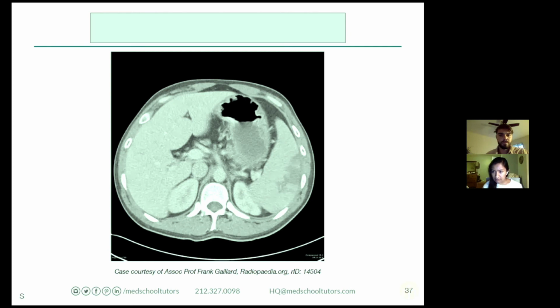Good. All right, so we have one person who's gotten it so far. Anybody else? Okay, good. Up to 2, 3. Okay, people are getting it now. All right. Very good. So the big thing here that I'm looking at is this irregular hypodense lesion in the spleen, right? This is not the same shade of gray as the rest of the spleen.